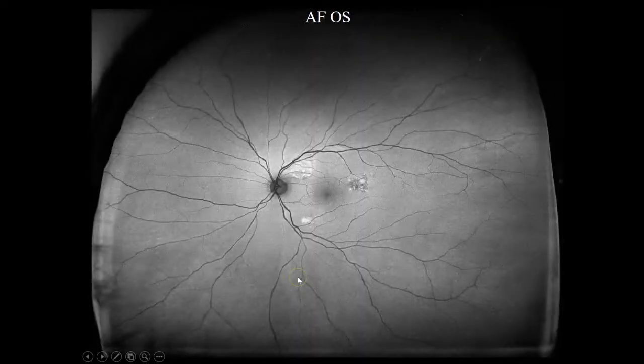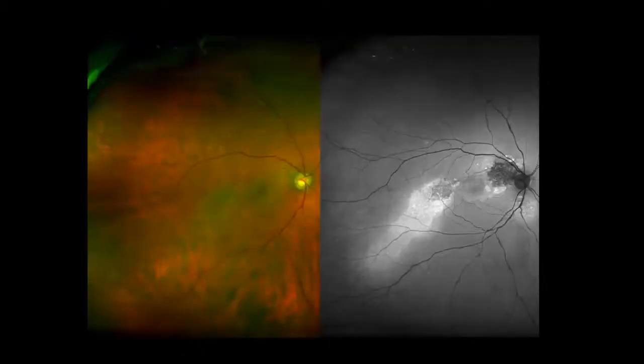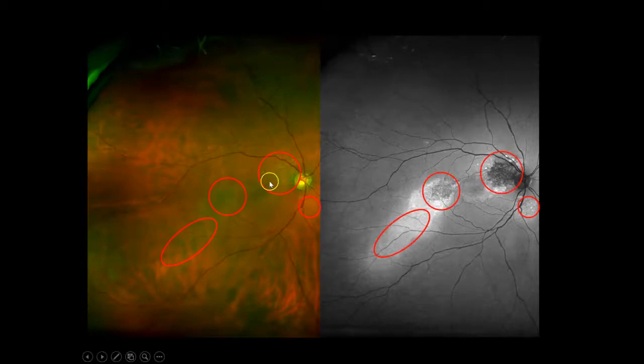We can now look at the left eye. Three lesions in the left eye that were not at all dramatic. I think what might be useful is if we compare the color to the autofluorescence, and we'll circle four zones. This zone over here on color looked pretty normal. Obviously, hypo-autofluorescent, dead retinal pigment epithelium. This zone looks minimally abnormal. This zone here actually looks normal, but that zone is showing hyper-autofluorescence, and the zone here looks normal, and it's showing hyper-autofluorescence here.